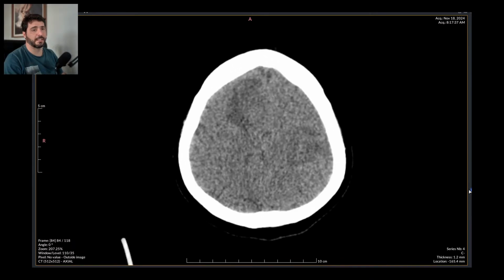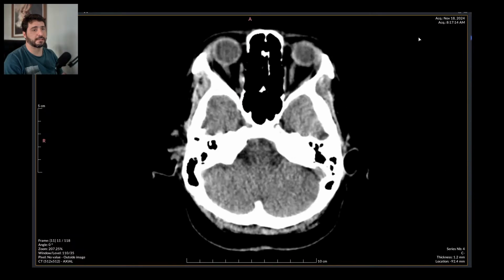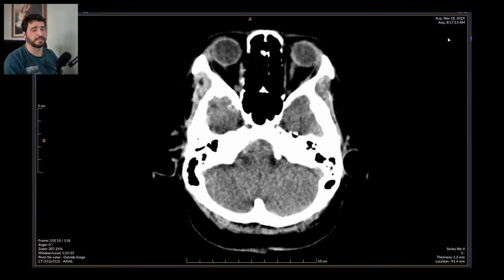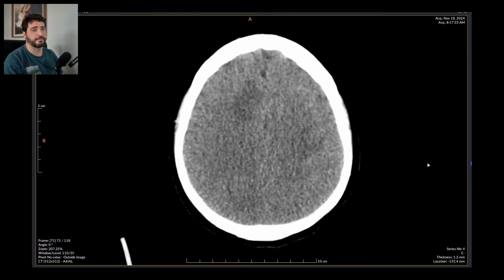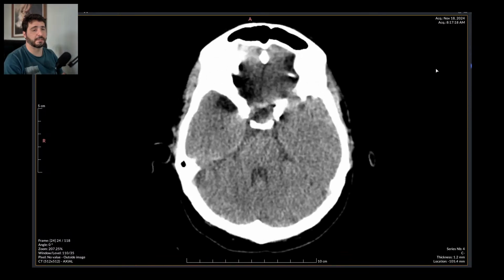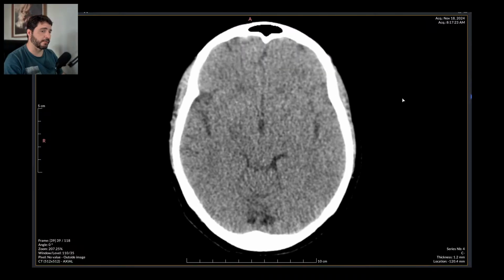This is not a proper arterial territory. This isn't even properly scanned. We have no contrast enhancement. This is a very, very old scanner. This is a very low quality scan. We have no contrast enhancement. We have no proper clinical history.